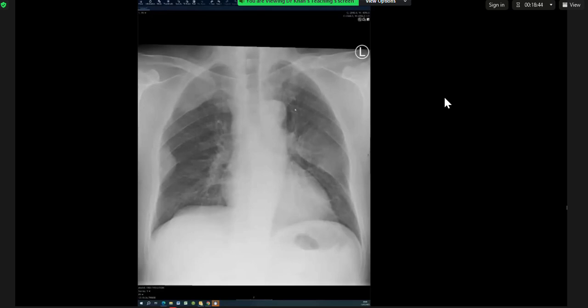Why the interest in mesothelioma, if I say the patient has no asbestos exposure and is 35 years old? Well, the reason is the paramediastinal lesion and the lobulated appearance with the destructive bone changes, that would be my primary differential. However, this can also be a primary bone tumor that is invading the bones, and in that case there would be a wide range of differentials, depending on the patient's age.